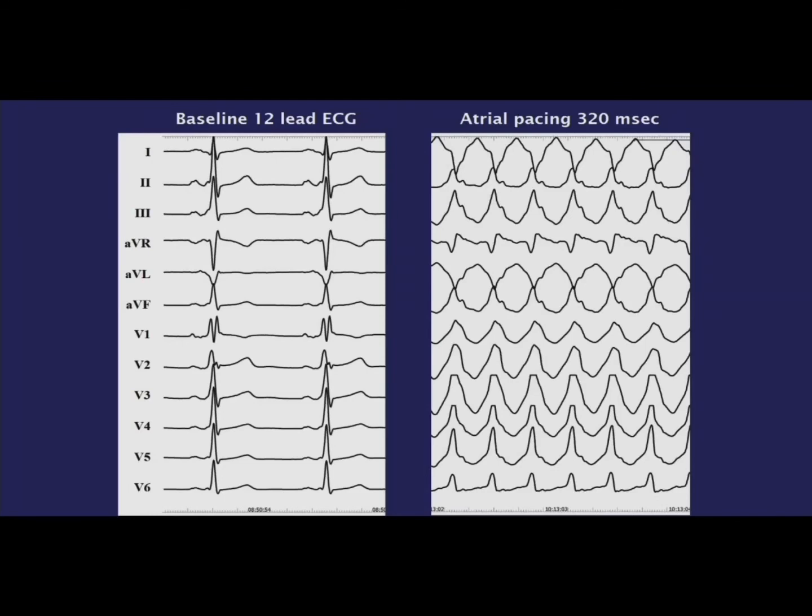Yeah. So middle cardiac vein. If you see a negative delta wave, very commonly, and Sonny will probably go over this, it's in the middle cardiac vein, and you need to go into the os of the coronary sinus, many times doing a venogram. Many times there's a small little diverticulum there, and you need to go into that. So this is just thinking about the vector of depolarization. You don't need to go through the algorithms, and you can figure it out just from those vectors. So sorry, Josh, to interrupt. No, but it's perfect.